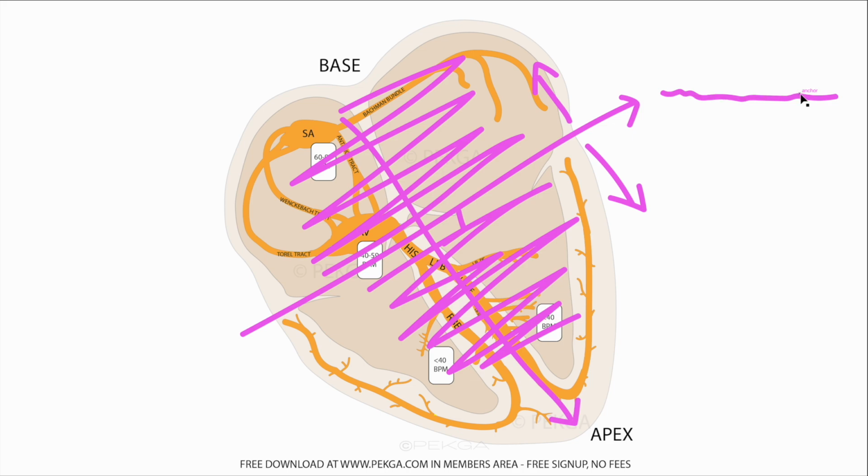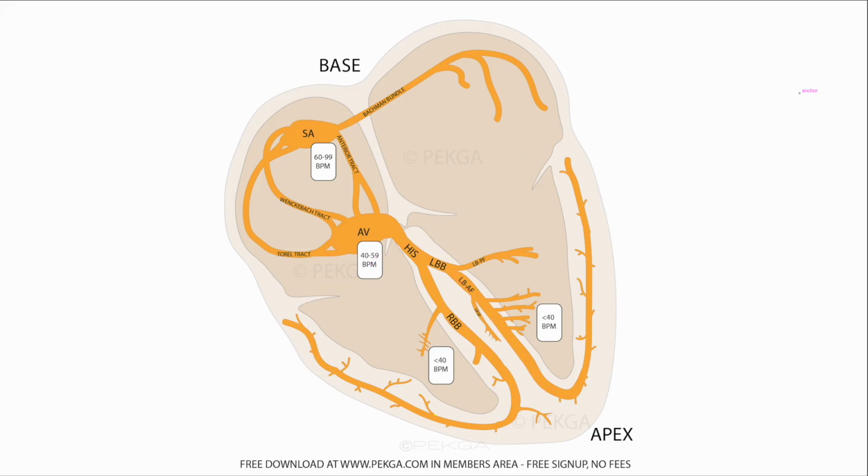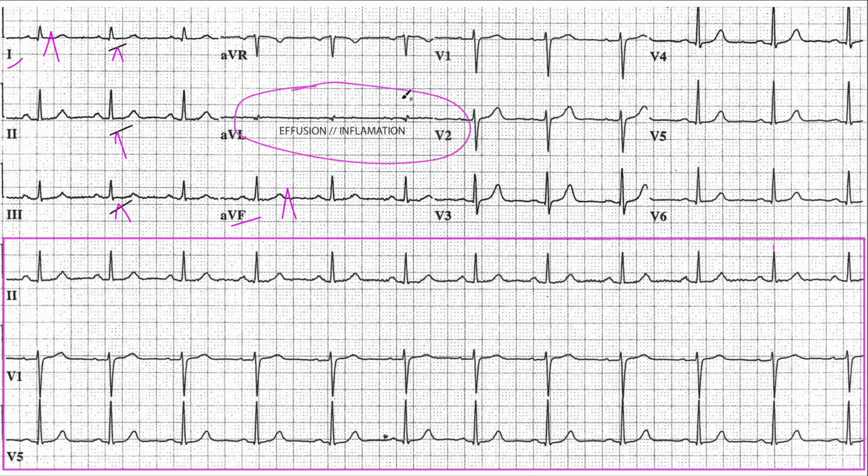I know this is a whole lot of purple, and in our classes we go into depth with a lot more graphics explaining what that means. But anytime you get an isoelectric lead, you can use it to deduce your overall axis of depolarization rather quickly. Here, I'm not sure that's the case. I don't know anything about this patient. No information was given to me, just the ECG. And I do not want to ignore this, okay? But if you're out in the field, first thing, check out mechanical issues. If that's not the case, this is a red flag that needs attention. All right, let's keep moving.